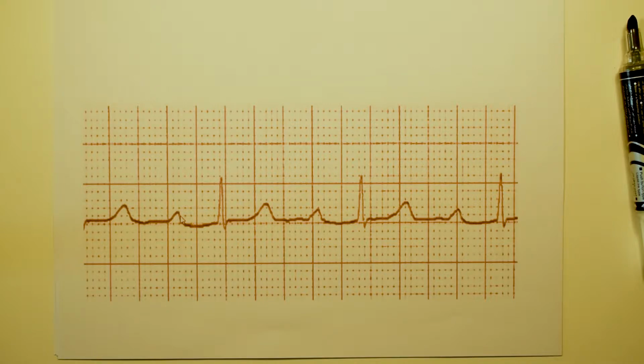Today we're going to continue with ECGs. If you haven't watched my previous video, I'd recommend you go check it out, because if you're not quite sure what's going on with this page, you know, PQRST and all that sort of thing, it'd probably be best that you jump back there quickly. But if you have watched that, let's get going.